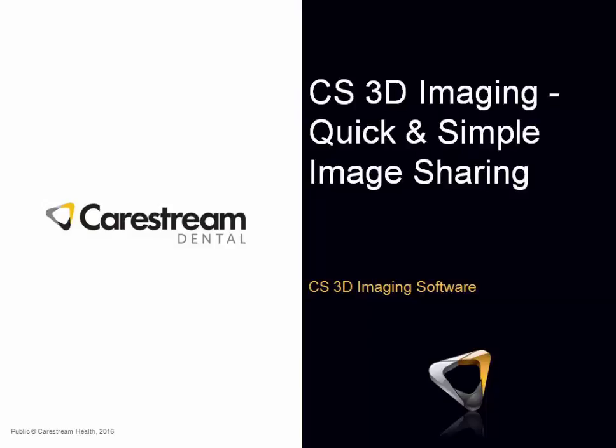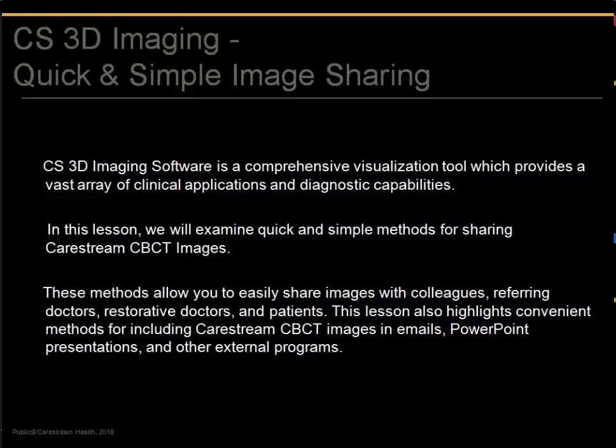In this lesson, we will focus on quick and simple methods for sharing Carestream CBCT images. Have you ever wished that there was a way to quickly and easily share your Carestream CBCT images with your colleagues, referring doctors, restorative doctors, or patients?